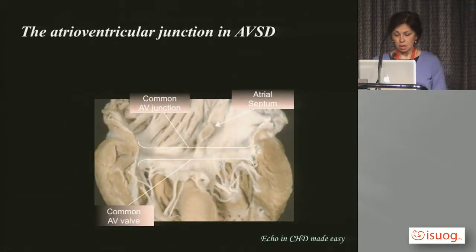And that is a kind of a four-chamber type view of that atrioventricular junction when that atrioventricular septum does not form properly. As a consequence, instead of having two separate orifices here, we have one valve going across from right to left, and you can see lots of leaflets here. They have much more redundancy to the leaflets than the normal mitral and tricuspid valves. And you can see leaflets that go from one side with chordae both sides of the ventricular septum.